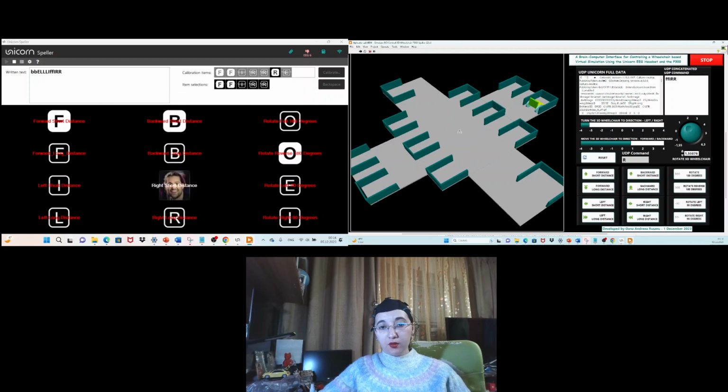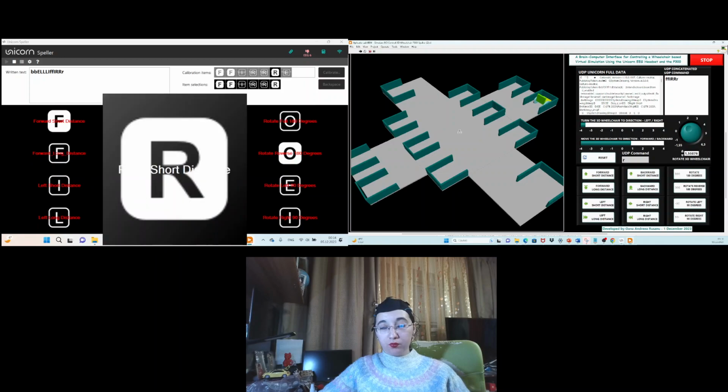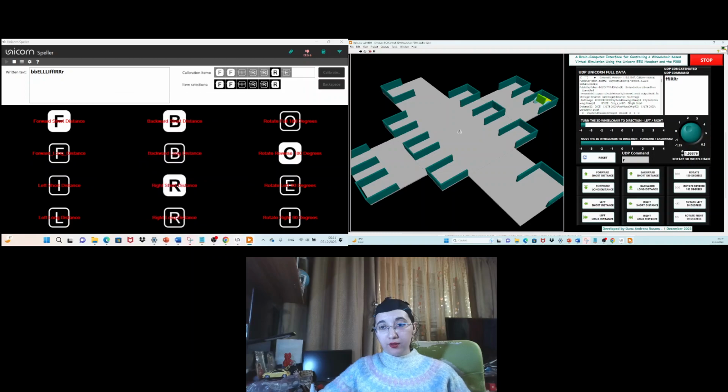Okay. And right short distance. It's okay. And in the end, rotate left 90 degrees.